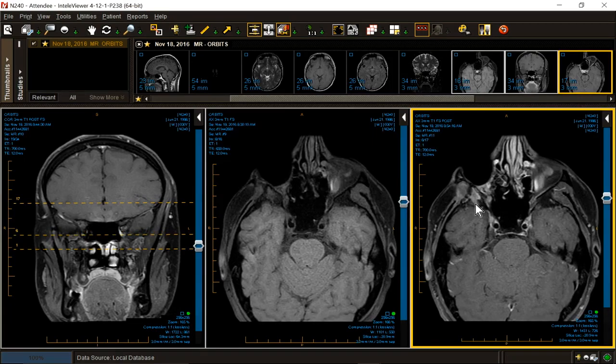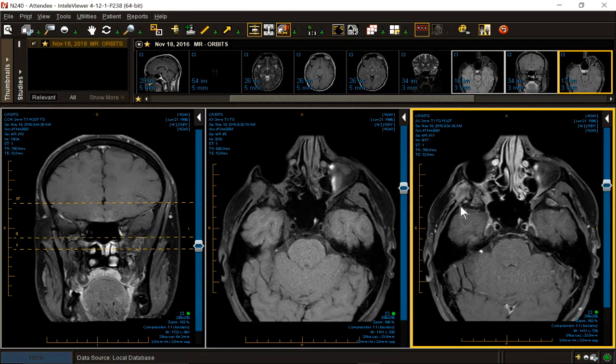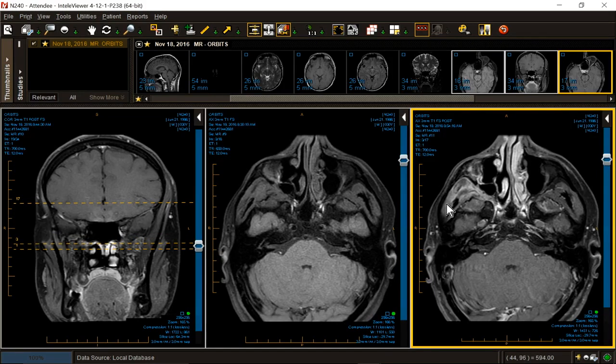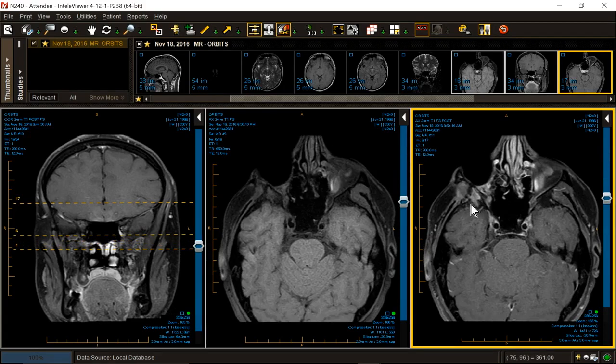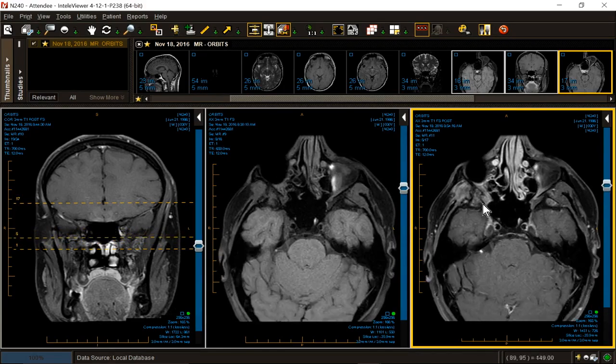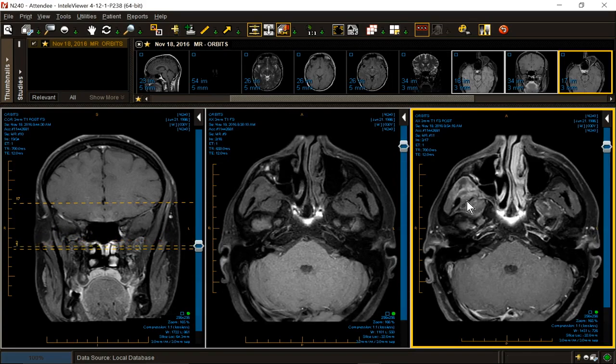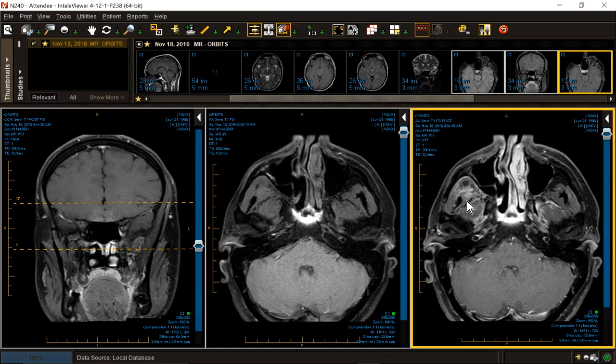It involved the zygoma. It involves the adjacent soft tissues. And it involves the temporalis fossa. So it is a heavily infiltrative lesion. It's not just involving the intracranial space, it's involving the extracranial space and spaces in the face. This is adenoid cystic carcinoma, and it is typically a very serpiginous, growing, almost impossible to cure lesion.